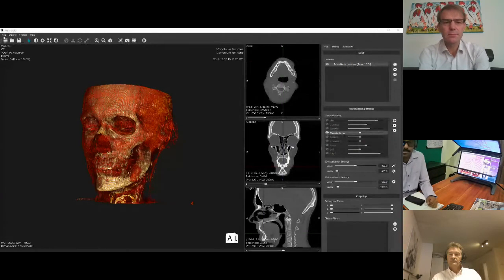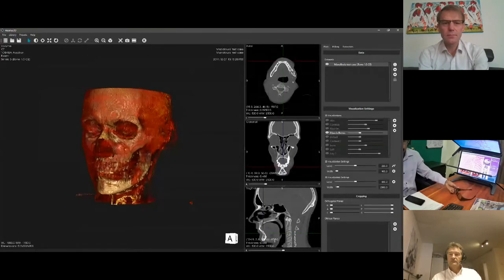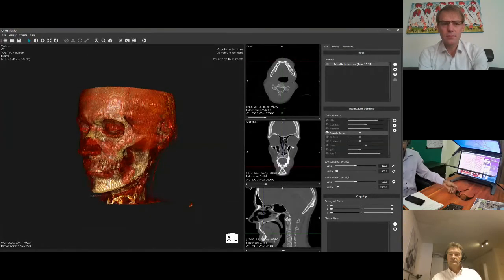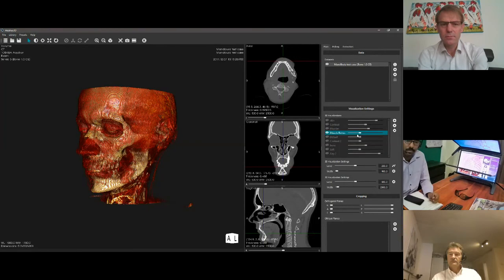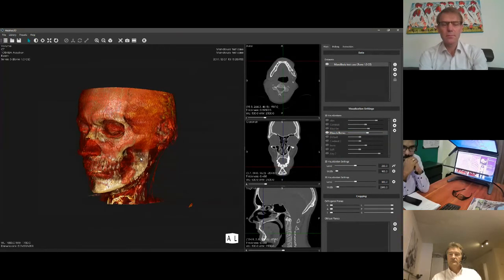Right now, I'm going into this data set, and over here I just loaded a data set. I went into our research projects. One of the projects we've done is a fibula to mandible operation procedure, which means the reconstruction of the jaw using a part of a bone from the leg.